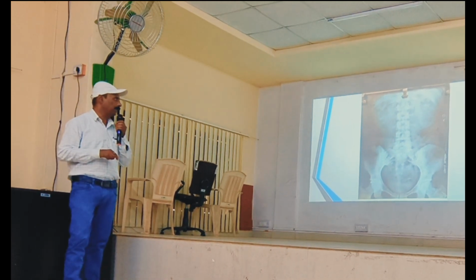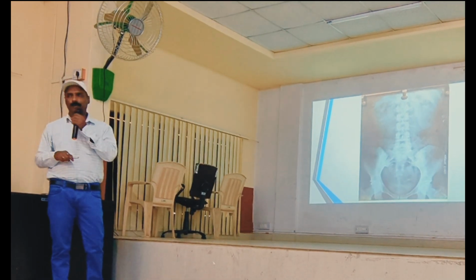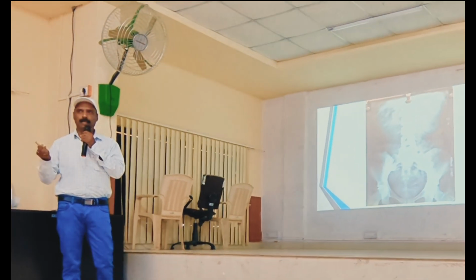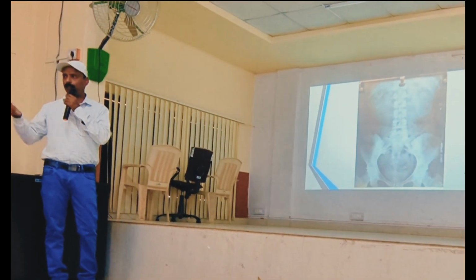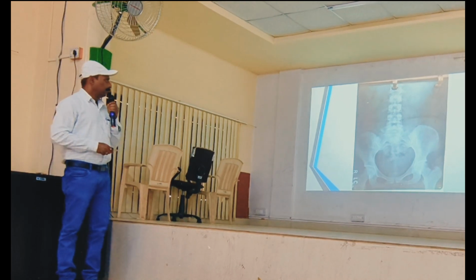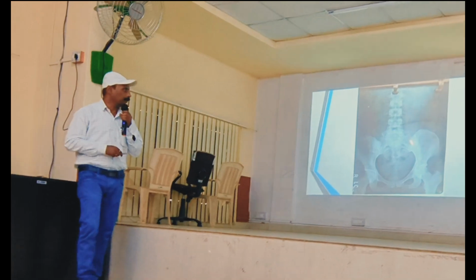So this is one simple X-ray which from my department we keep for spotting to correlate with the pyelography. I will highlight it: when you remember this plain X-ray, how it is, then you will understand what the pyelography is. This is also the same, highlighting the pelvis and all that you have to remember.